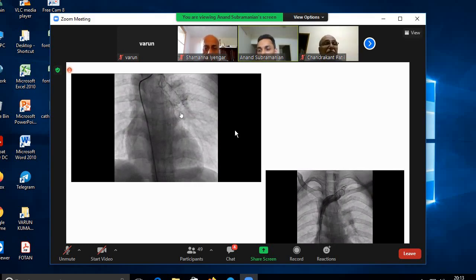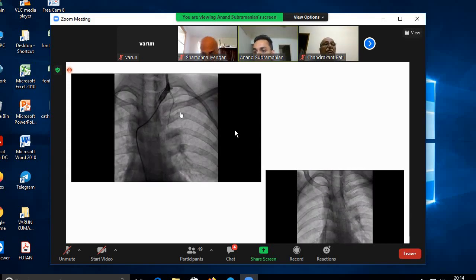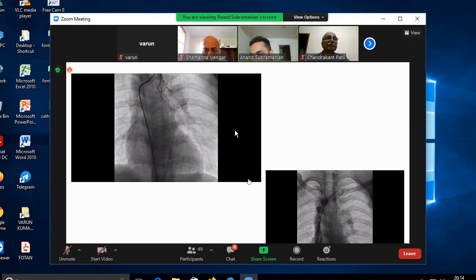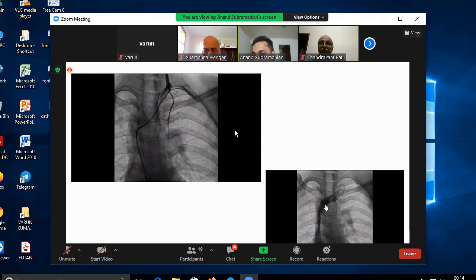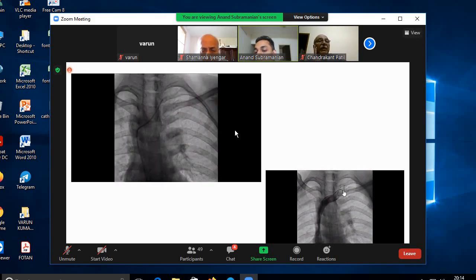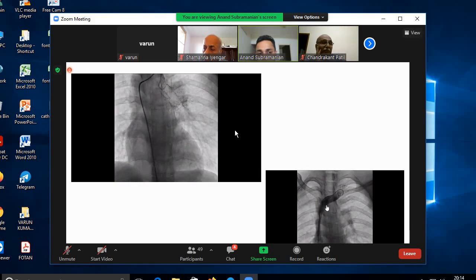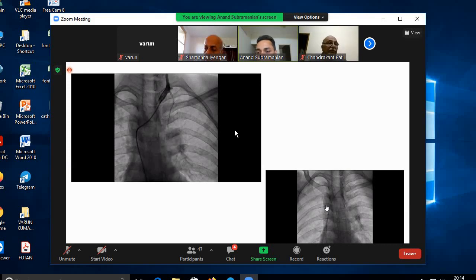The second reason why we do this angiogram is for the course of the innominate vein. If you look here, the innominate vein normally traverses above the arch. Look at the bifurcation over here: the ascending aorta comes over here and the arch comes here, and the innominate normally goes above that. Now, an important association in patients with TOF is a retroaortic innominate vein, in which the innominate vein passes under the arch, inferior to it. This is not of any importance to us as cardiologists, but the surgeon might benefit from this bit of information because it helps him plan SVC cannulation.